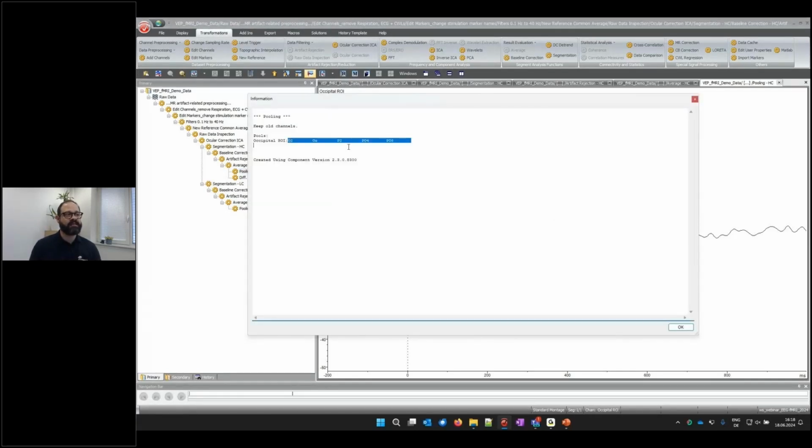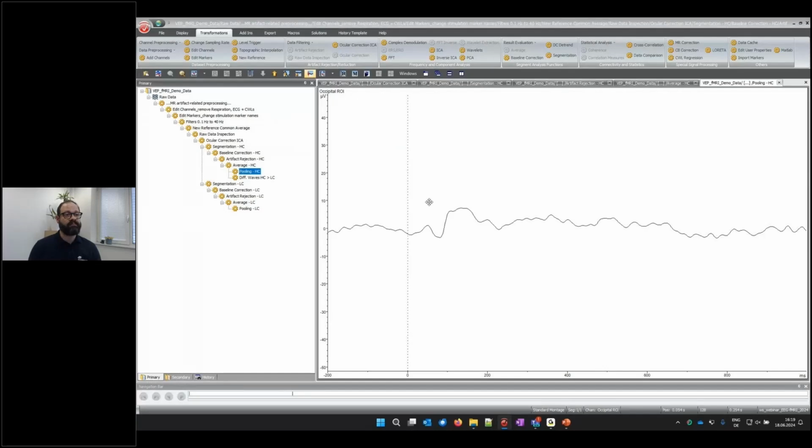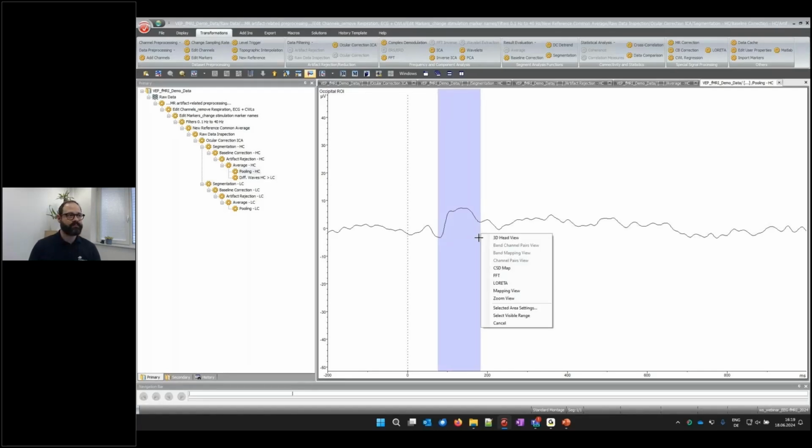So actually, this pool is built out of occipital and parieto-occipital electrodes. However, more to the right side, because you saw maybe also now on the map that we have a more right-sided distribution. This can help. For instance, you get a little bit of a smoother signal because you're averaging across electrodes. And then this could give you a nicer idea of the time extent of a component, for instance.